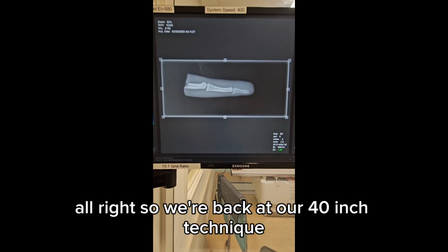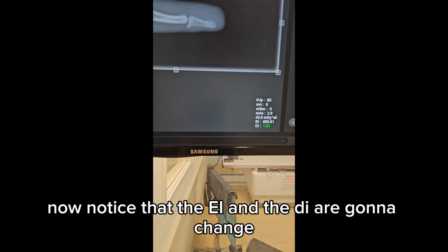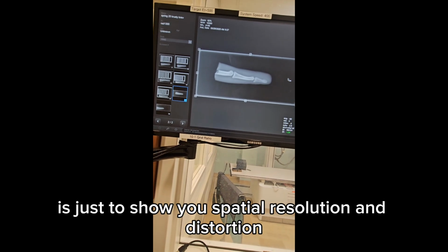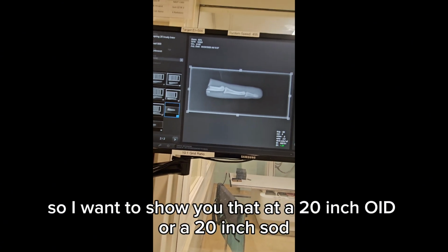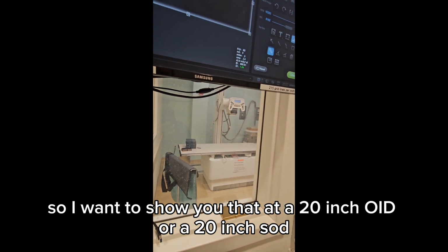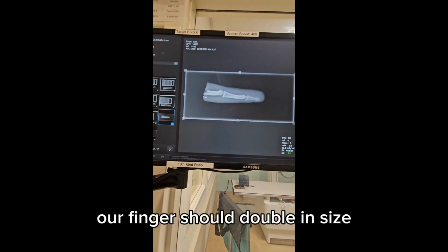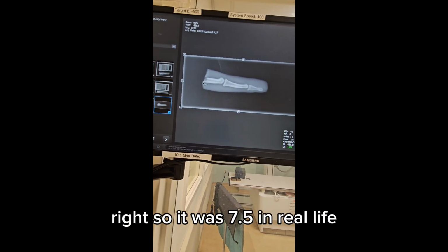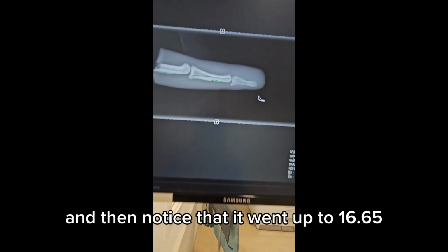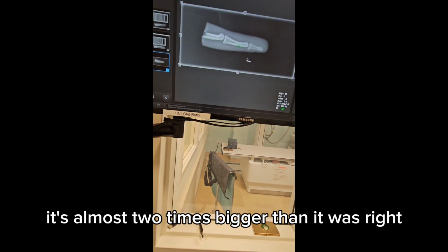All right, so we're back at our 40-inch technique. Now, notice that the EI and the DI are going to change, but I don't care about that. The whole point of this part is just to show you spatial resolution and distortion. So I want to show you that at a 20-inch OID or a 20-inch SOD, our fingers should double in size, right? So it was 7.5 in real life, and then notice that it went up to 16.65. It's almost 2 times bigger than it was, right?